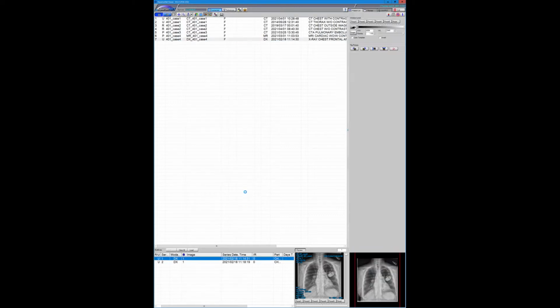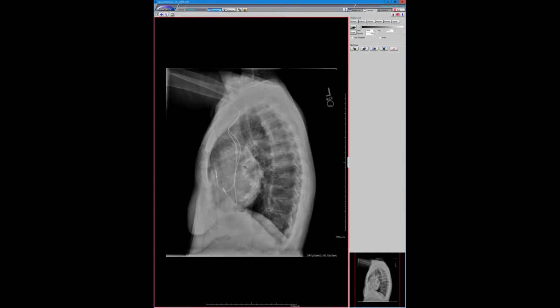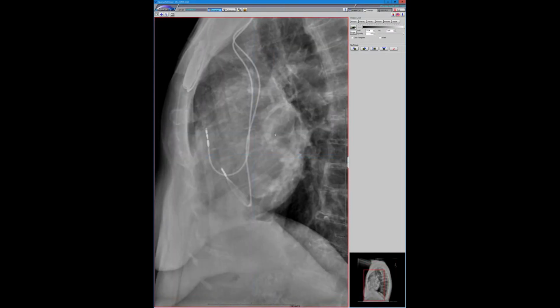And we've seen cases of caseous MAC that, as I said, oh, and then I said, oh, why don't we look at the plain film, because we actually had a plain film to clear her for MR, and you can see that. I'll show the lateral. So there's really pronounced caseous, or at least there's mitral annular calcification, but there's this big ball here, which is presumably that caseous portion, which corresponds exactly to where we expected that lesion to occur in that inferior lateral segment at the base. So I told our junior faculty that they could tell them to get a gated CT, because it'd be a nice correlation.